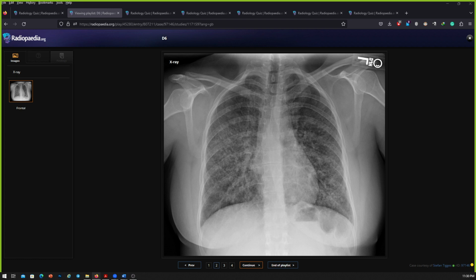In my normal routine practice, I would get the clinical history of this patient regarding any occupational exposure or any drug intake. No such exposure was there. I will also confirm if this patient has any history of malignancy, and if the previous X-ray is available, I will compare my findings with the previous chest X-ray to look for interval change. Okay, previous radiograph was not available.